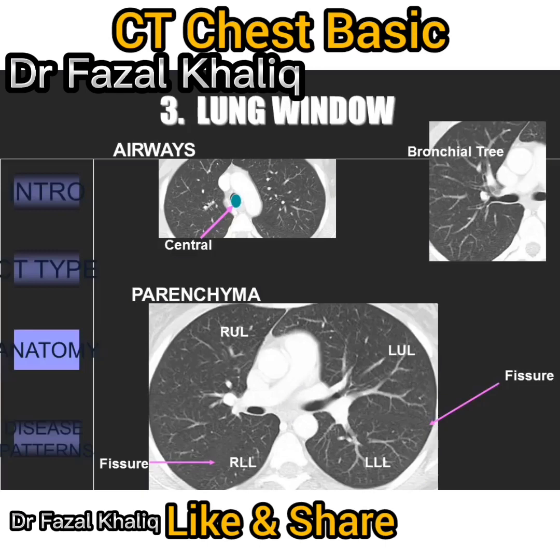Often, the radiologist will be looking for nodules here. They are tiny white flecks amongst a sea of other white tiny flecks. How can you identify them? The answer is to follow the vessels. If the white flecks move, then this is a vessel. If they do not move on 3 consecutive slices, you can be sure there is a representation of a 3D structure and not just contrast within the vessels.